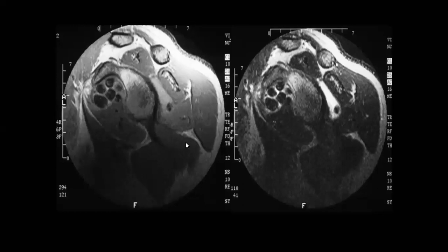Before we go further, what could it be? Is it axial, sagittal, coronal? Perfect. It is sagittal. Nice. So if it is sagittal, where is the anterior and posterior? Yeah, I can see this is the anterior and this is the posterior.